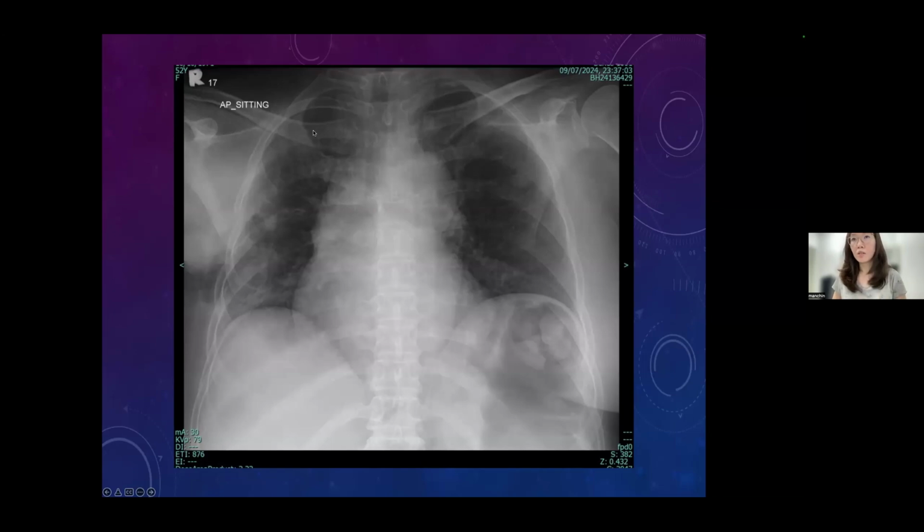So what else? In this X-ray, other than the lung field, you see nodules here, right middle lobe and then left. So these are lung mets, and there's also consolidation here. But look at outside the lung. Do you see this part here outside the chest wall? It's actually a fungating breast tumor. There's also emphysema changes at the soft tissue here that can be shown on X-ray.